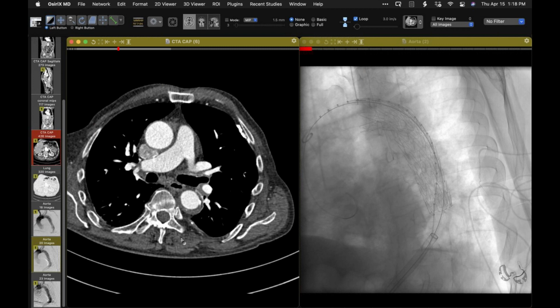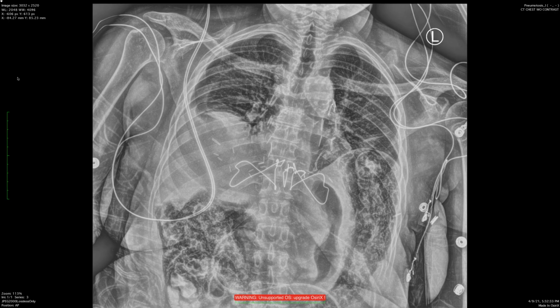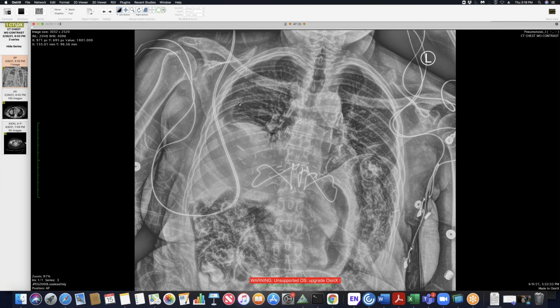Yeah. Certainly they're influenced by what information they had and the patient having an episode of chest pain, and they treated the patient with a stent, as you can see there. But I actually don't think that the patient had that separate pathology. And of course, we'll never know whether this here is actually a cause of chest pain or something new or not, because we don't have a comparison otherwise.